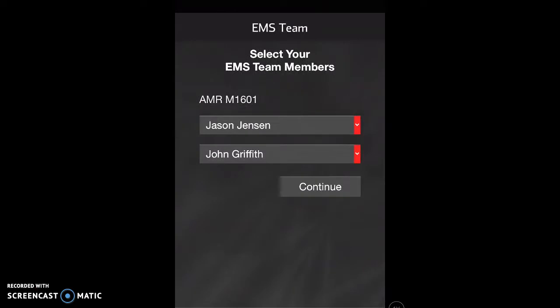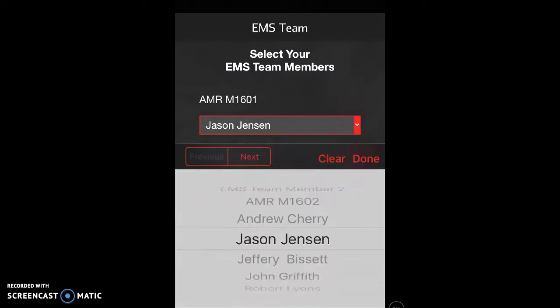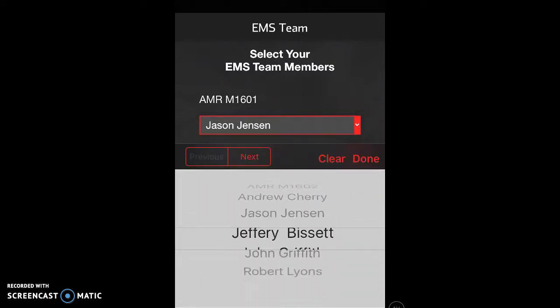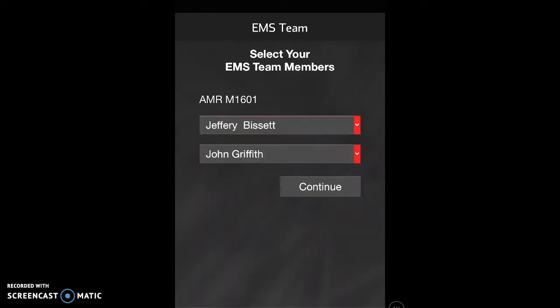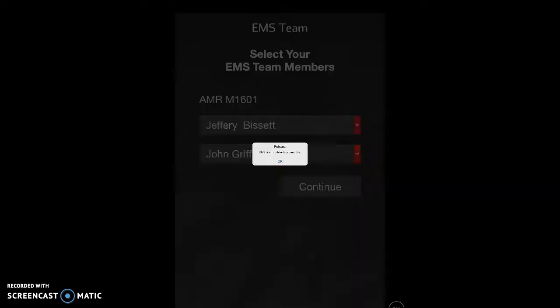Once logged into the system as a medic unit, we're going to select our team members from the drop-down list. As you can see here, we have a few people already built. Today it'll be Jeff Bissett and myself, John Griffith. Go ahead and hit continue.